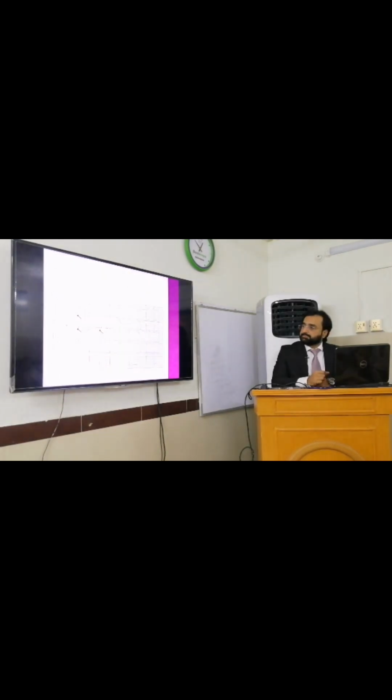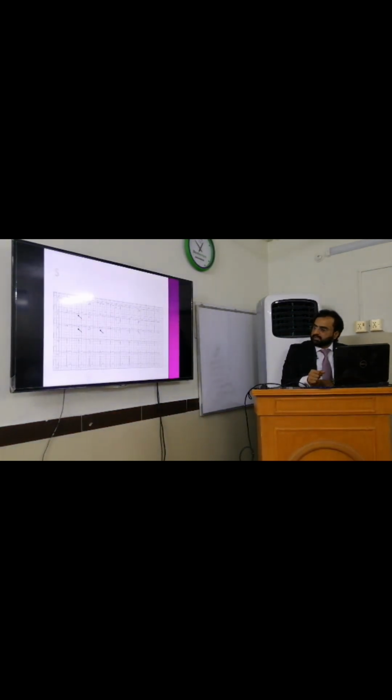Right? Okay. So here you see the ECG depicting an accelerated atrial rhythm. Just try to concentrate on the arrows showing the P waves and the QRS morphology. How would you interpret this? You see, what is this?